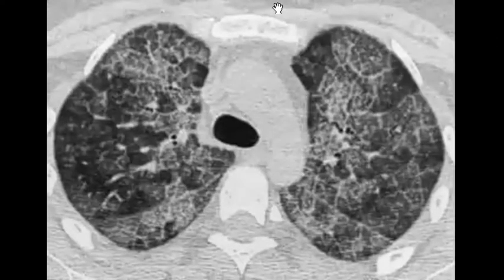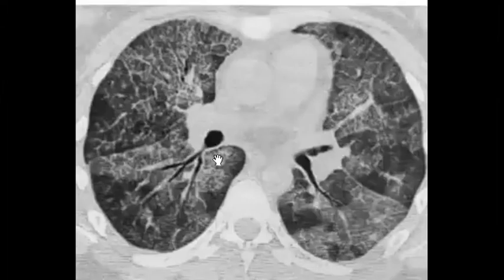So there is ground glass, interstitial thickening, smooth. Smooth or nodular septal thickening? I think it's going with smooth. Yes, smooth septal thickening, and bilateral, maybe sparing the periphery. Okay, and bilateral, smooth septal thickening, ground glass veiling with smooth septal thickening.